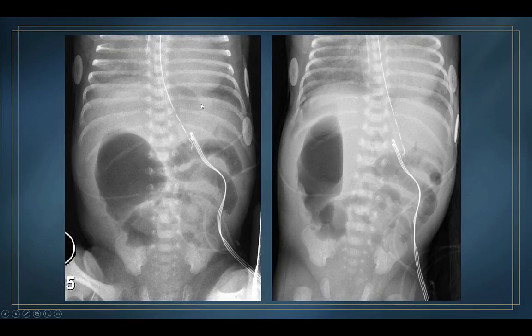This is another patient. This is a cupula sign. If you notice, there's not a whole lot of air in the stomach at all. And even if there was, this should not be confused with air in the fundus of the stomach. You could argue again, is there some slight lucency over this portion of the liver?